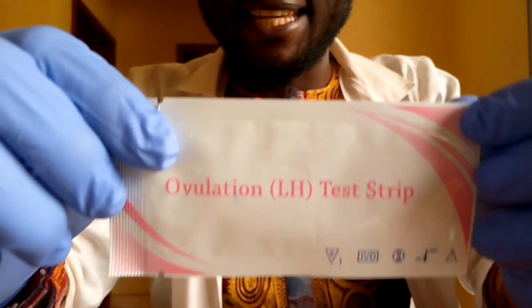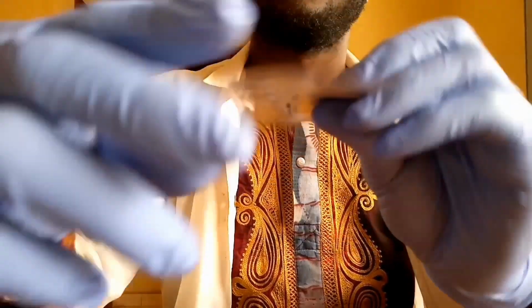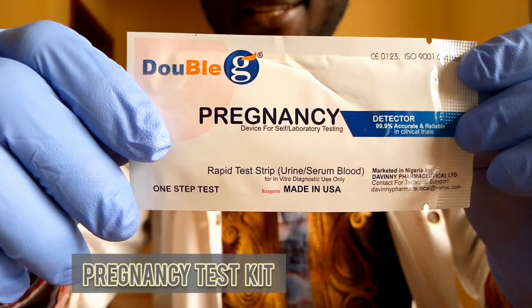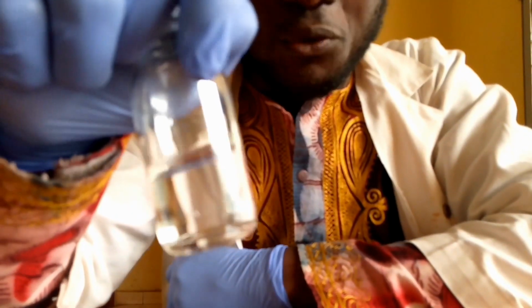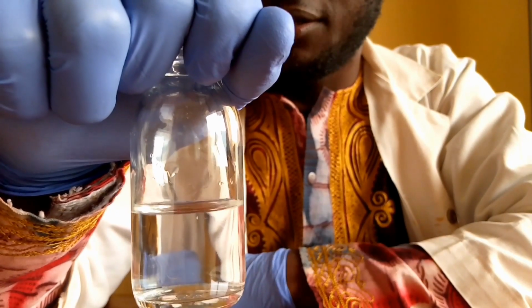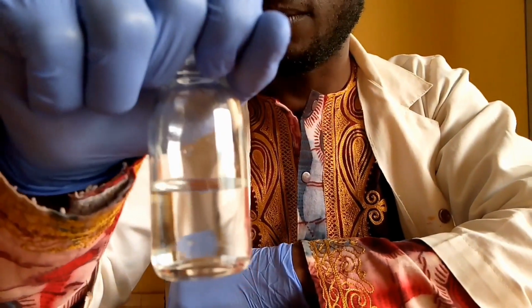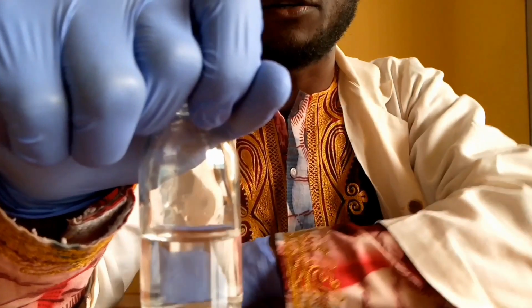Now, this is our ovulation test kit. This is our pregnancy test strip. Now, this is our urine. Actually, this is water. The reason is that we're touching a lot of gadgets, and we are going to use this water as the control, since we already have the result that we are going to explain, but we're going to use this one to carry it out so that you'll see when the result will be out.